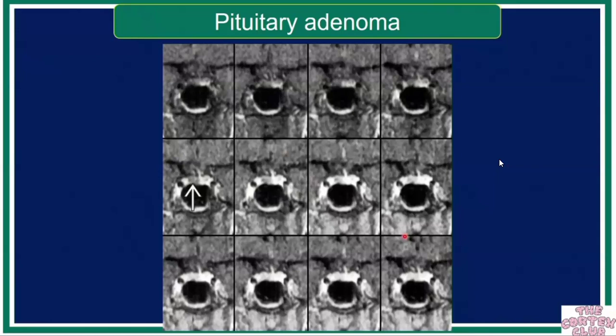Over time, some of these lesions may enhance as much as the pituitary gland, and that's why we do this dynamic contrast enhanced sequence. But then it is this hypoenhancing structure that we have to localize and visualize against the enhancing pituitary tissue, which helps us identify smaller adenomas. Now, these days, people are also talking about nuclear medicine techniques, and dotatate imaging has come in handy, or some people are doing research on that and saying that dotatate can actually detect more adenomas than even MRI.